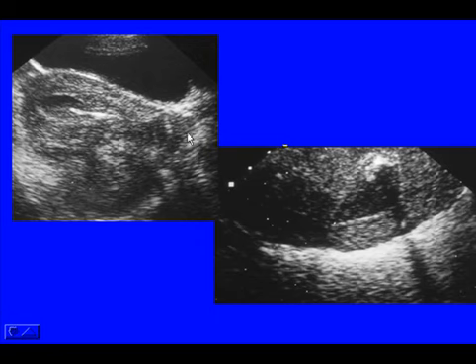Another patient, transabdominal study, shows a longitudinal view of the uterus with a complex endometrial fluid collection. Within the fluid collection, we see this linear echogenic structure. Transvaginal better delineates the endometrium. We see nicely the mucosa of the endometrium, echogenic complex fluid collection within the endometrium, and this curvilinear echogenic structure with shadowing consistent with gas. This confirms that this is endometritis.